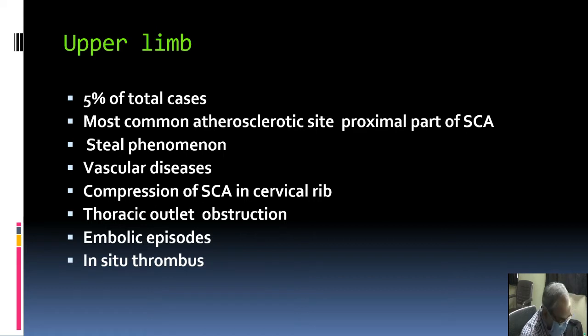Sometimes you get embolic phenomena in the upper limb. The axillary artery is quite a common location for these embolic episodes, or the brachial arteries also. Nowadays most of the coronary interventions, the angiographies and the angioplasties, are done through the transradial route. So because of the increased number of interventions, you can sometimes get upper limb Doppler patients for local Doppler to look for any hematoma, or sometimes thrombus due to long-term placement of an indwelling catheter for either thrombolysis or angioplasty.